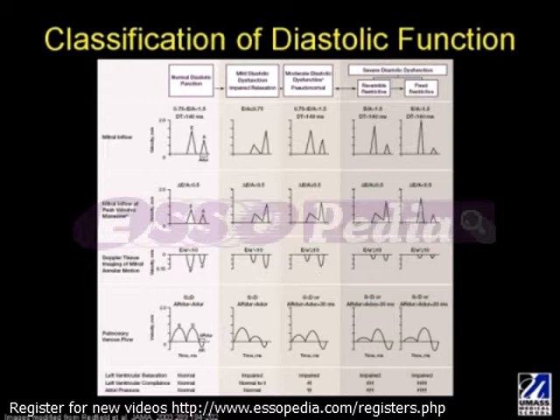Valsalva maneuver is very helpful in differentiating normal from pseudonormal filling by reducing the mitral E wave and increasing the E wave deceleration time. This maneuver unmasks the underlying relaxation abnormality, and this filling pattern indicates elevated left atrial pressure and LV end diastolic pressure.